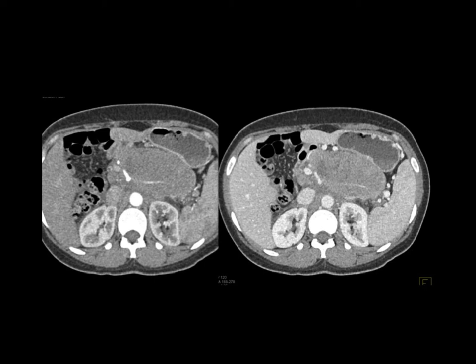Pancreatic adenocarcinoma would be infiltrative. It could be lymphoma that usually displaces the vessels. That's a possibility. Spen tumor, it's a bit old for a Spen tumor, but it's possible. But Spen tumors typically displace rather than invade. This was an infiltrating tumor, and although it's not vascular, this was a neuroendocrine tumor.